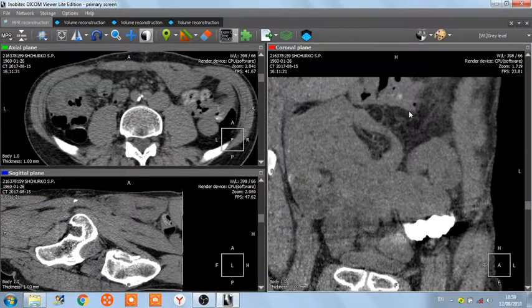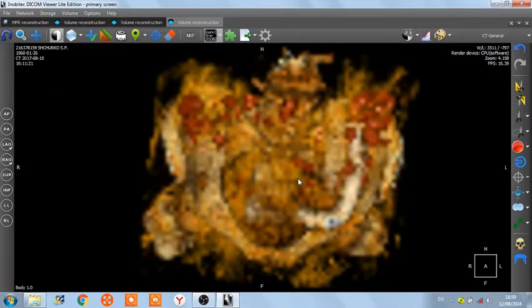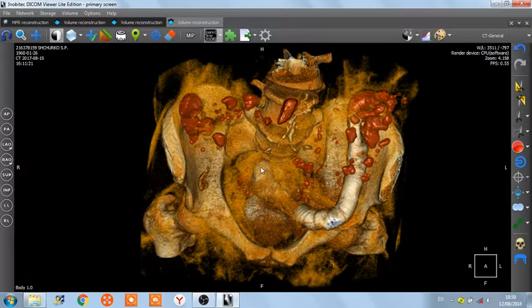As I said, there is nothing to see here, so I prepare the 3D dimension, those one. So what we have there is rectum, sigma, and colon. It's an important thing because the colon is stuck here, and those liquid stop coming here, and then I will show why.